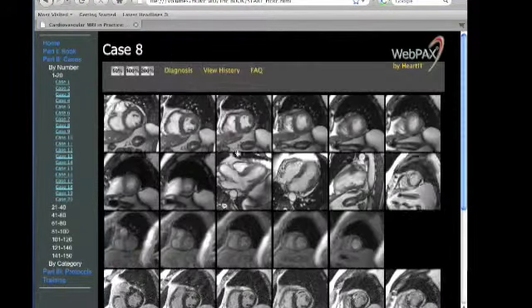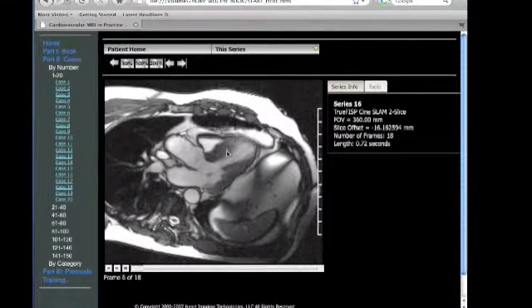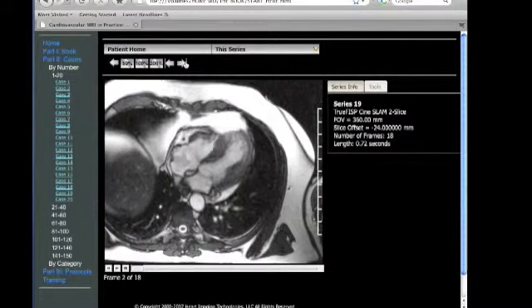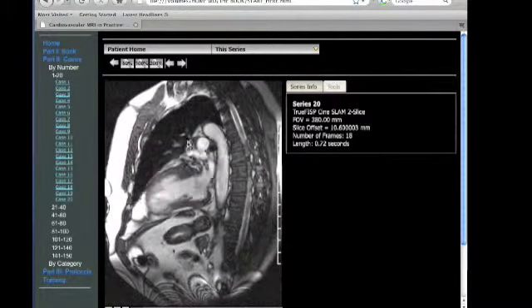septum. Review of the long axis images confirms these abnormalities and demonstrates on this 3-chamber view marked akinesia of the anteroseptum. This is confirmed on the 4-chamber view, and the 2-chamber view in fact demonstrates anteroapical dyskinesia.